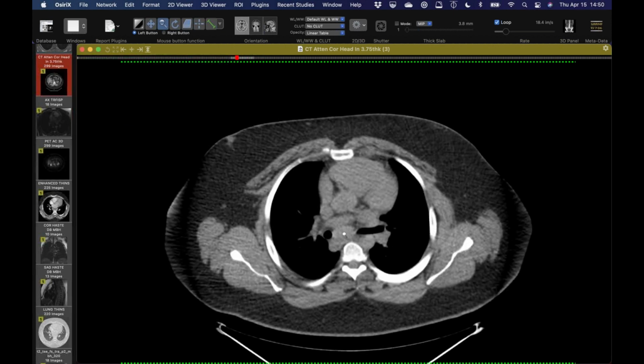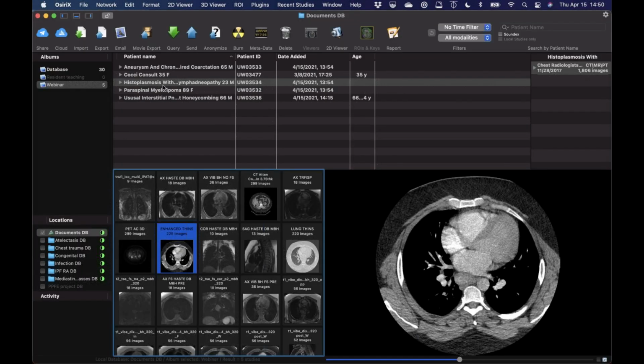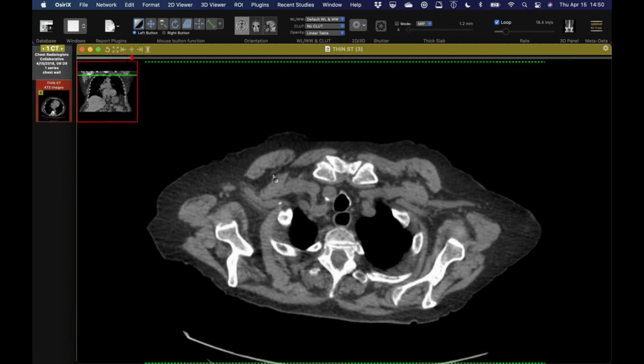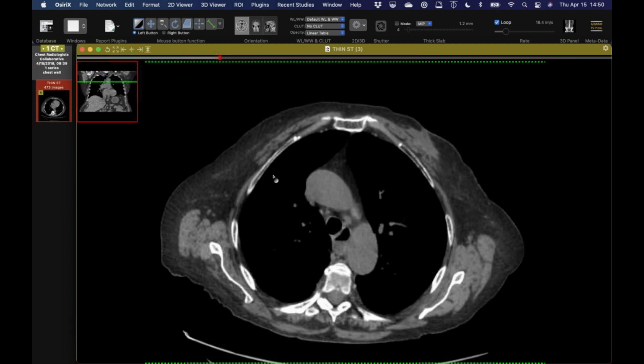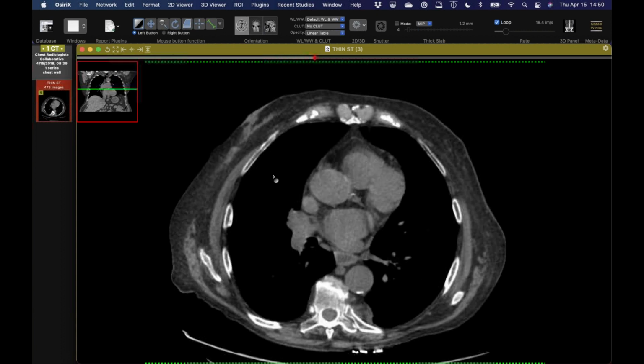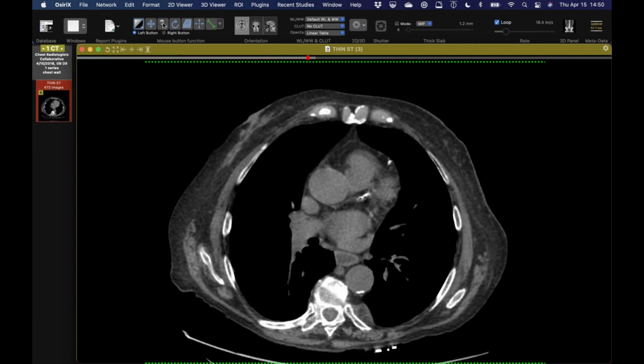So this is in the subacute phase, but there's still probably a lot of inflammation as this starts to heal. And these lymph nodes may shrink down as the infection is cleared, but we do see calcium in there. So I'm pretty confident that this doesn't really need a biopsy quite at this time. I'm not worried about a neoplasm. Agreed. That's very interesting.